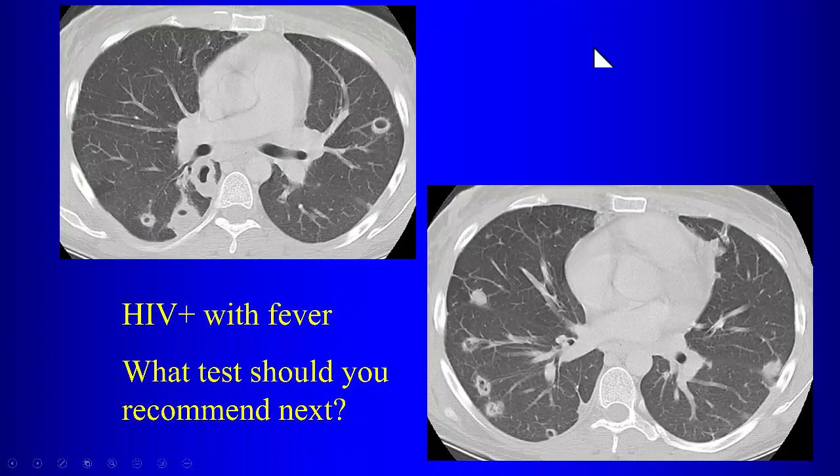This is also very typical in patients who are HIV positive. They can present to the emergency room with signs of infection. The chest radiograph is not very revealing, or the findings are at least very difficult to interpret. That's why your threshold for doing CT on these patients should be very low. Even if the chest radiograph looks normal, the CT can be quite revealing. What test do we recommend next in this patient? Echo? Yeah, echocardiography in somebody with septic emboli. We're looking for evidence of endocarditis.